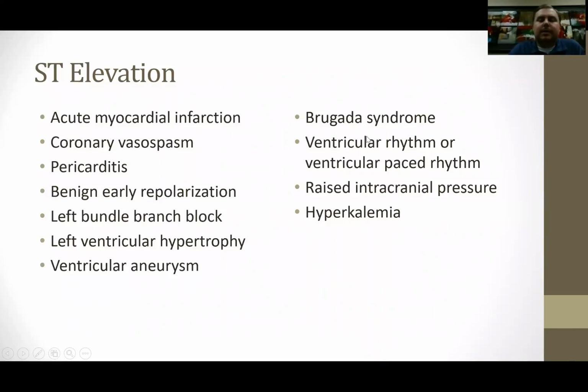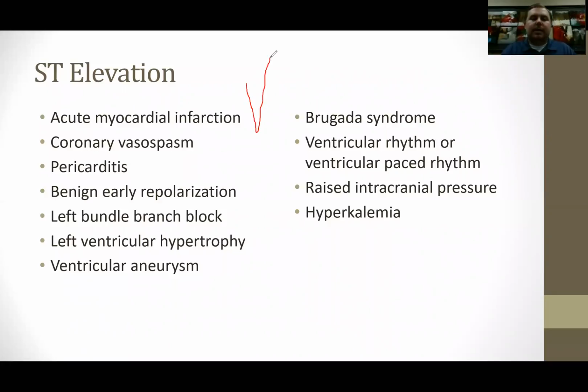Brugada syndrome is a pretty interesting pathology that's common in Asian cultures, and it's a cause of sudden death. So if it's not identified at a young age, then a 19-year-old just drops dead. They go into VFib or VTach, and if nobody shocks them out, then they obviously die. That looks like right bundle branch block, so like in V1, it has an S wave at the very end, and it's wide, and then it kind of just maintains this down sloping ST elevation.